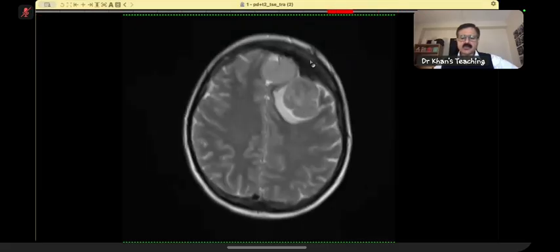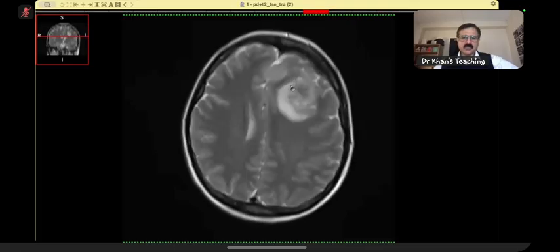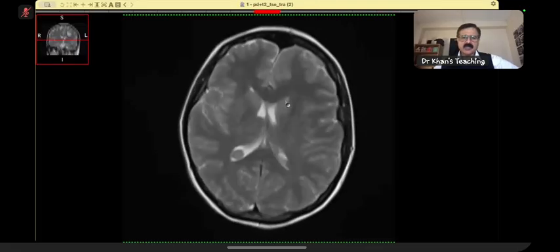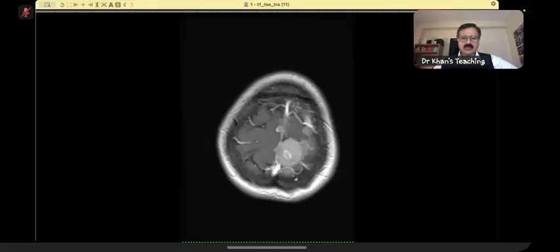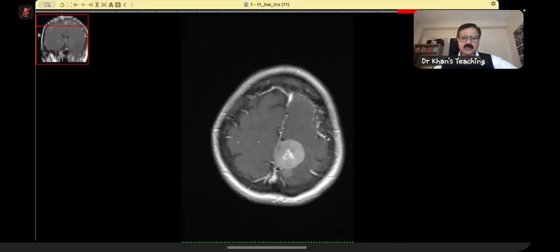Here, I think you should have called that there is a bit of hyperostosis when a meningioma is next to a bone which is thickened. So that's a Brownie point. There's a bit of midline shift. And of course, this one I'll show you with contrast. Now, post contrast, all of them enhance. Actually, there are multiple others also.